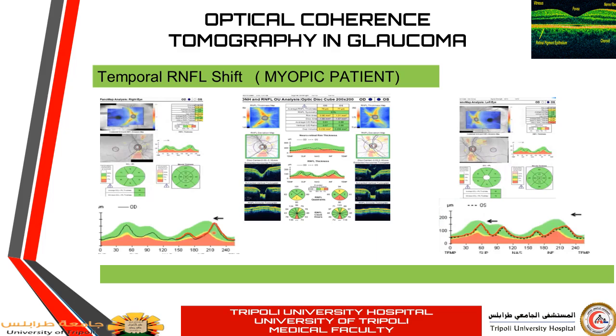As you can see at the arrow here, the apex of the thickness is deviated from the normative data, that is the green. So you should remember this anatomical variation. The thickness is good, but the curvature does not coincide with the normative data. He has normal thickness, but the appearance of the elevations is deviated from the normal, as you can see here.